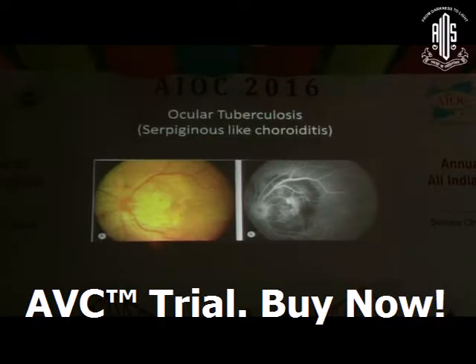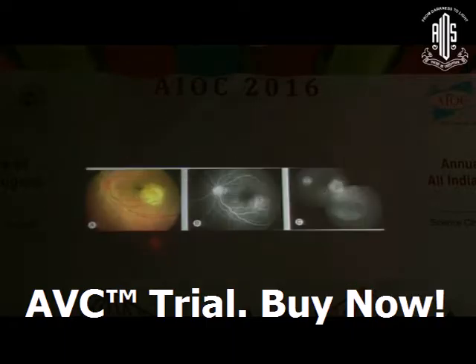So the healed lesion gives a hyperfluorescent area in the center, and the peripheral part gives a hypofluorescent area. That is a choroidal tubercle in the left eye of the patient, abutting on the fovea. As the angiogram progresses, it becomes hyperfluorescent. And later on, there is pooling of the dye in the area of the exudative detachment.